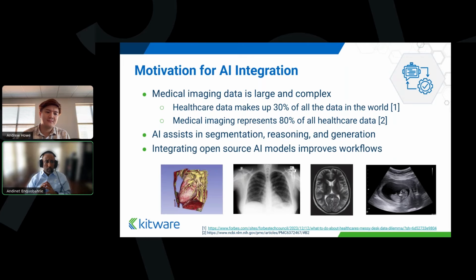Also, one of the reasons we're very excited about these NVIDIA Clara AI models integrated into VolView is that rather than having a separate workstation or a separate application to run your AI models, you can run your AI models within VolView. So you have an integrated application, from loading your data, doing some pre-processing, running your AI model, then reviewing and inspecting your AI results in one unified application.